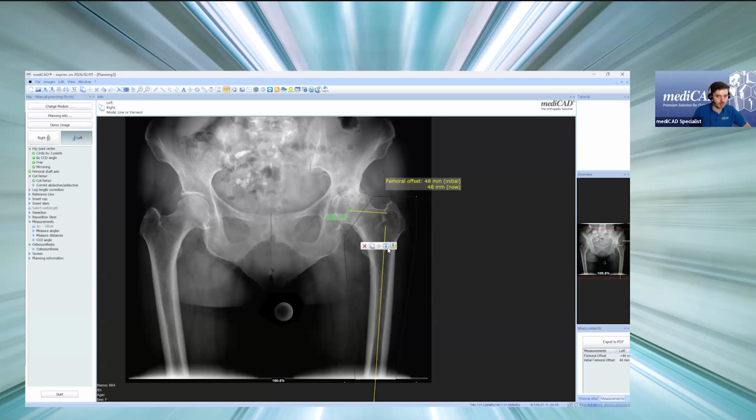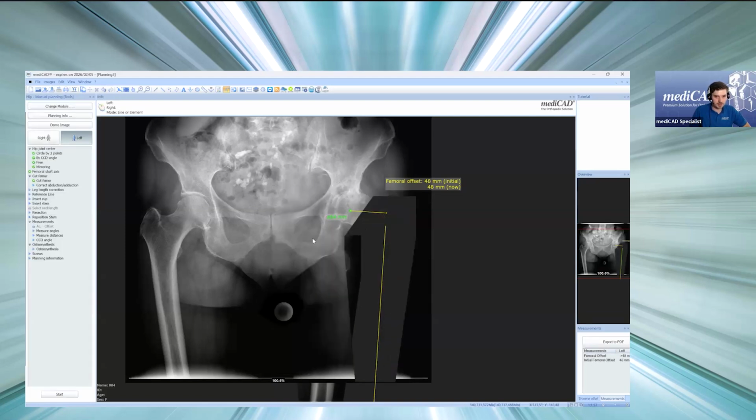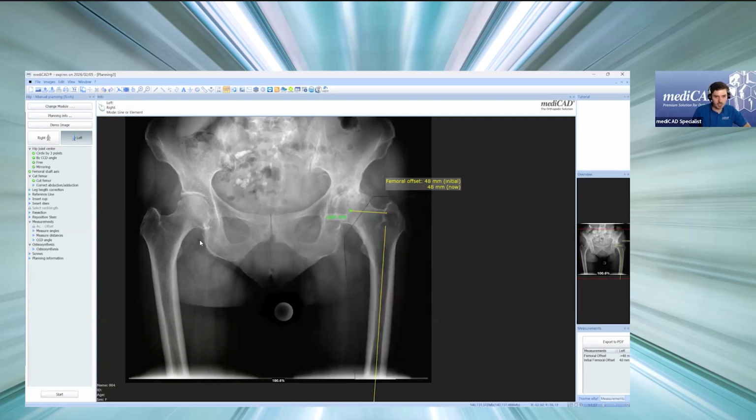So we can either put it in the foreground or the background. For example, now if I select the background and move it, you can see the color part of the image is behind the main image, and this also works vice versa, obviously. So we can do this with any image parts.